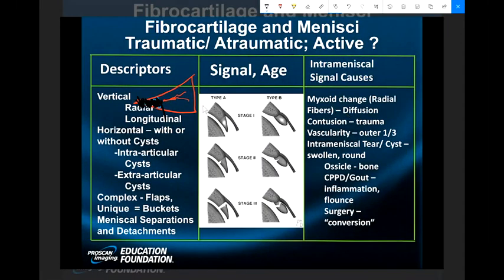So I'm not chasing this unless the meniscus is twisted, there's locking, there's a cyst, there's maceration, it's extruded into the gutter. I'm not doing an arthrogram. Don't do arthrography for post-meniscectomy knees except in unusual extreme circumstances, maybe in a failed repair, where you have to know whether the sutural repair of a bucket handle tear is competent. That would be an indication.